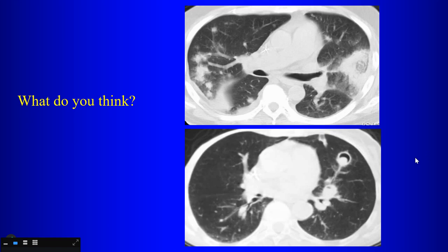So this is typical of what? Aspergillosis. What form? If it's aspergillosis, we call this angioinvasive. Yeah, so it's angioinvasive aspergillosis. This tends to affect what kind of patients? They're not asthmatic, no, they're immunocompromised. They're usually neutropenic patients, so acutely immunocompromised neutropenics.